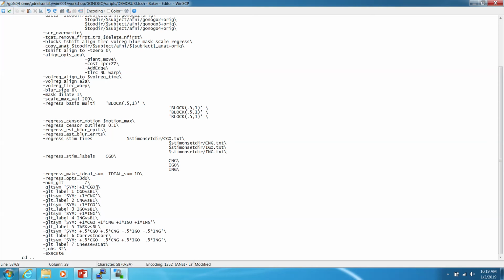So basically, positive things in this image I'm going to create are composed of this one contrast. Because we don't add anything else, it's implied that that's tested against everything else that is not an event.